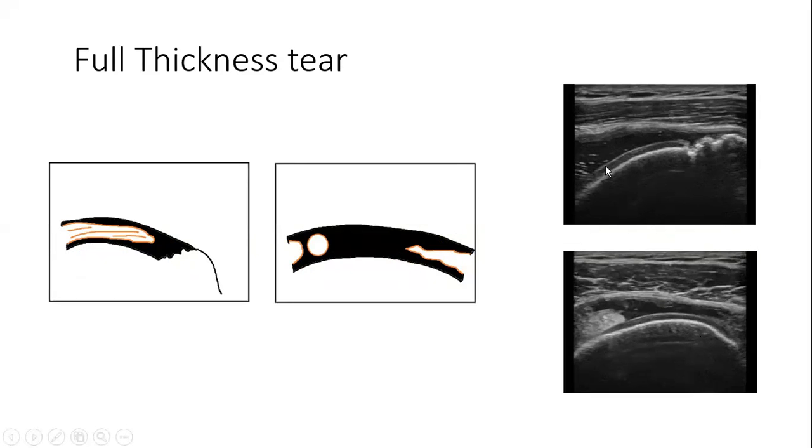And what's that sign? Someone answer this question. What do we call this sign? It's a Barsha. What's that? I don't hear it very well. Say it one more time. It's a bursa, it's inflammation. Oh, no, it's not bursa.